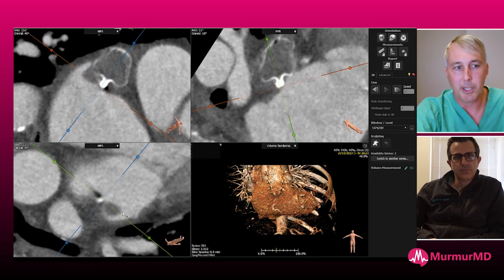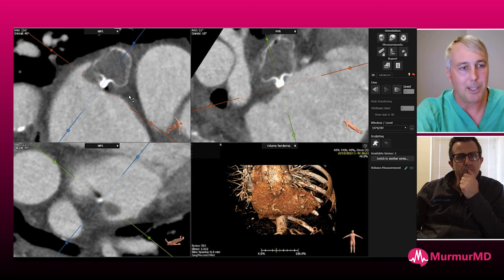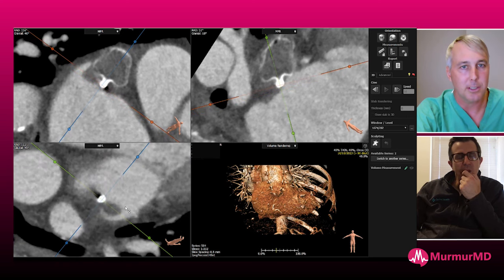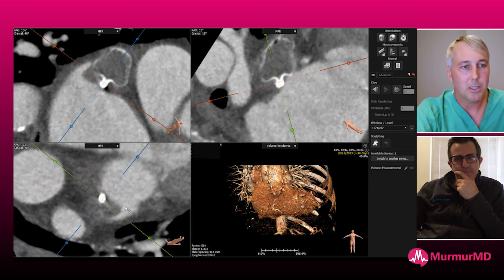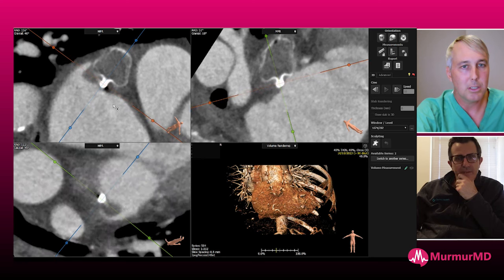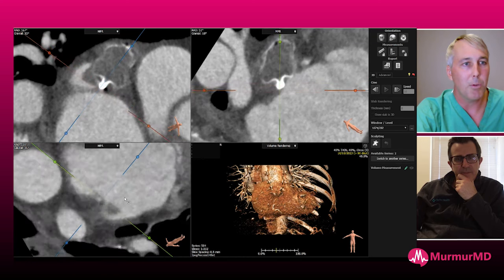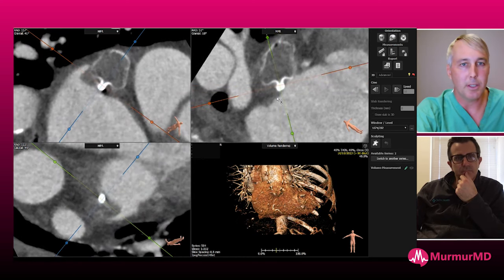So this patient we put on anticoagulation, and I actually don't see a follow-up on her. So I apologize for that. But, do you see how this looks a little different than what we saw in the last case? Yeah, definitely. I see your point about the non-linearity of it. It's more complex and non-uniform.